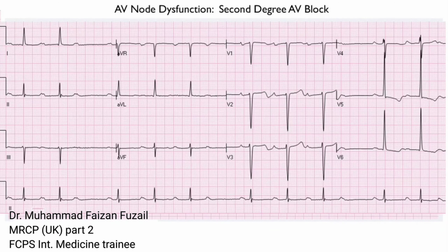You'll start to wonder if there's a pattern here, a pattern of irregularity. Yes, it's irregular, but what you have is a group of QRS complexes, and then a pause. Then here's another group and a pause, and here's another group and a pause, and then it keeps on going. So this is actually known as group beating, and group beating is pretty characteristic of AV block.